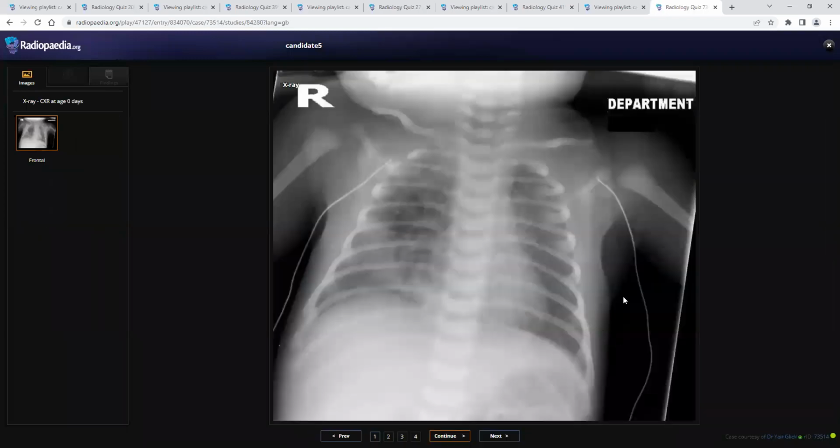Yeah, the child neonatal X-ray with some medical issues. Okay, so this is a frontal chest projection of a child. I can see some lucencies involving the right lung, in particular the upper and mid lung zone. The contralateral left lung and the right lower lung zone appear apparently unremarkable.